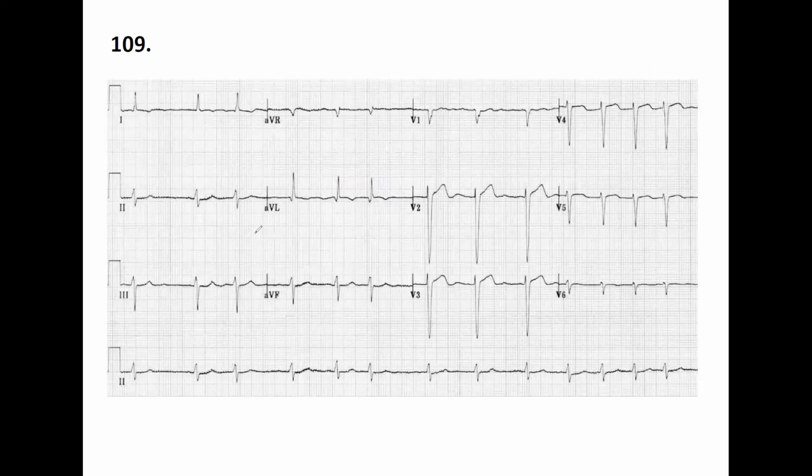So first of all, it is a regular rhythm because there are four big squares between each R wave, around 75 beats per minute. You are looking at the same tracing that I'm looking at. Oh, yeah, it is irregular. Exactly. That's irregular, yes. And this is why it's difficult to calculate the rate, because it's difficult to see where these 5 squares are coming. Maybe I try to interpret it.